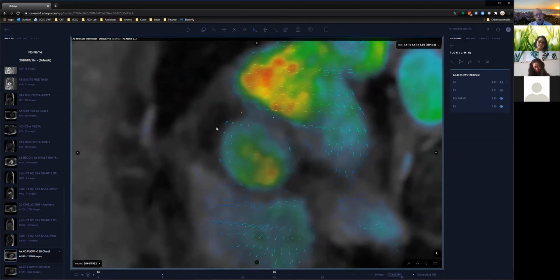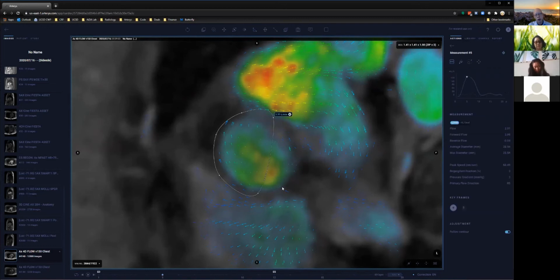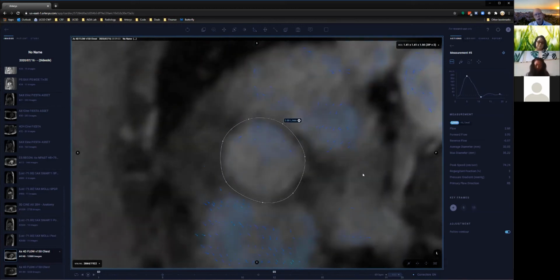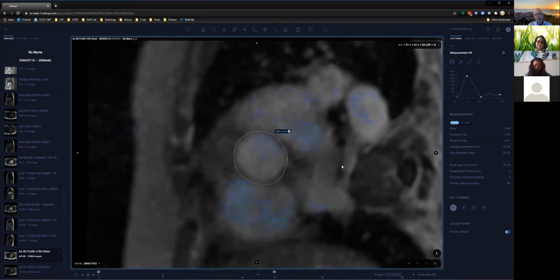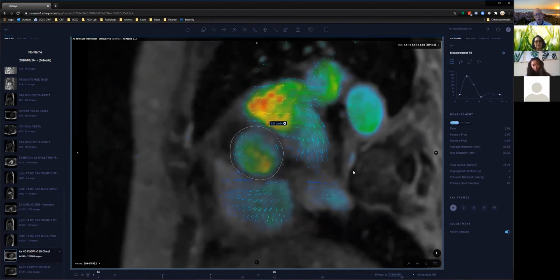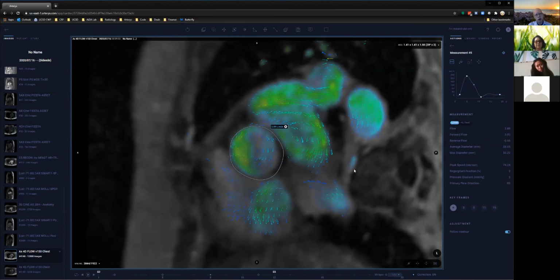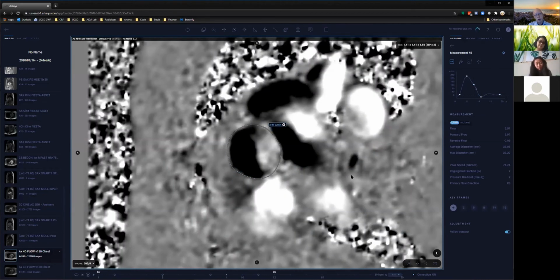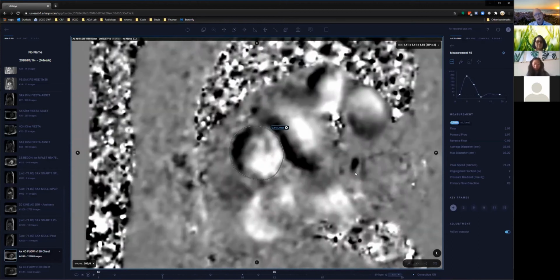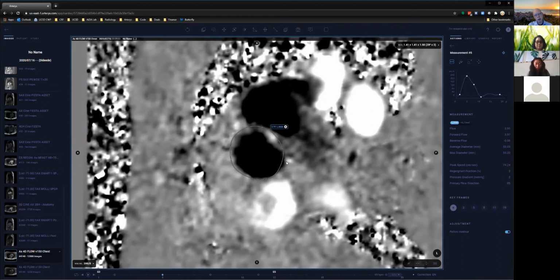I'll just measure at the ascending aorta, but we can do another measurement at the aortic valve just to get a sort of upper and lower bound of flow measurements. So is everyone following what I'm doing? Yeah, pretty straightforward ascending aortic flow measurement here. Now I'll also toggle off and on the phase data. That's just hitting number 7. So, all right. So that's roughly it.